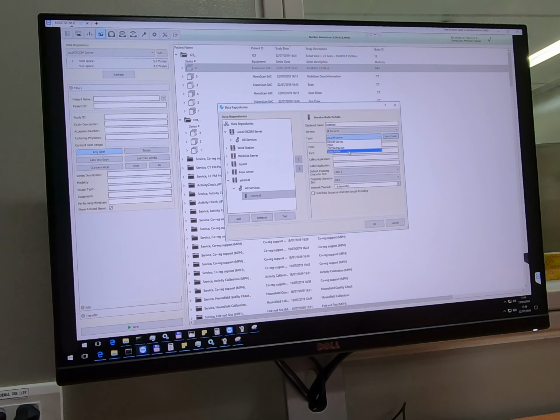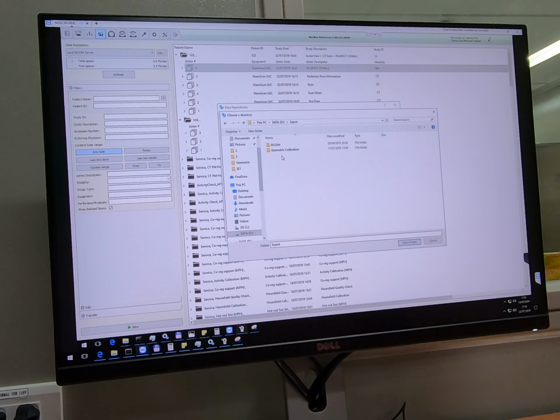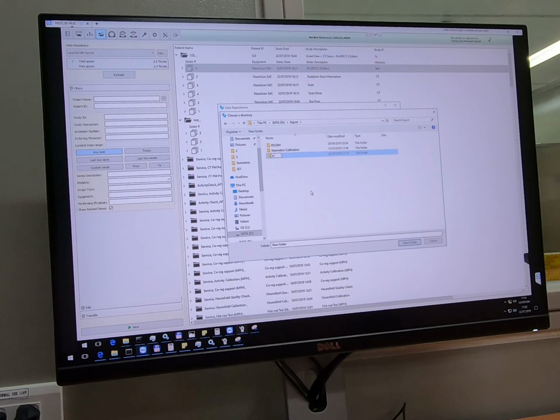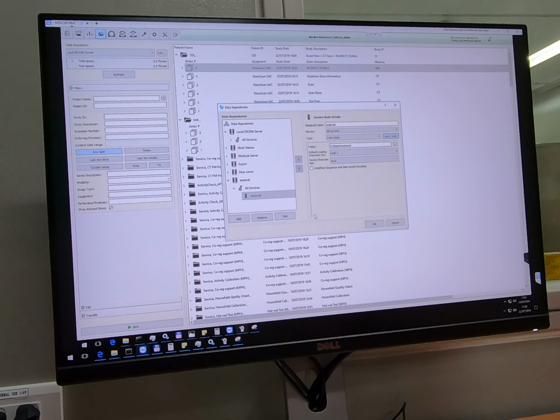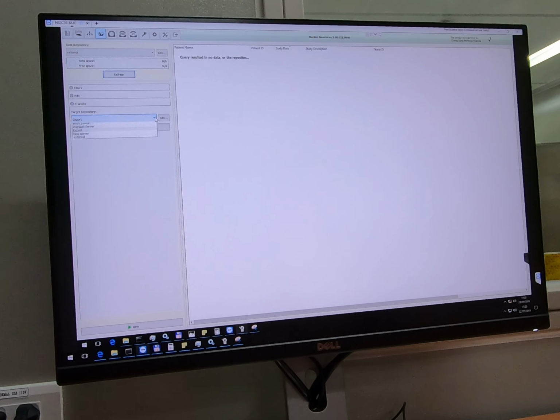And it will be a data folder on the computer, not another DICOM server or anything else. And let's put it in the D, export, with the same name, but the name actually can be anything. Select folder. Of course, it's empty. But if there is any DICOM set in that folder, you could import it to the local DICOM server. Okay, so once you want to do something like this.